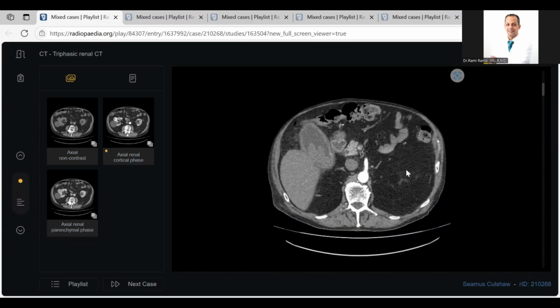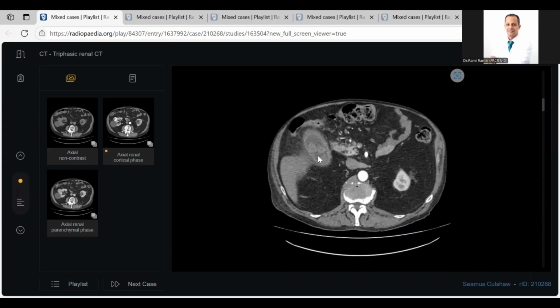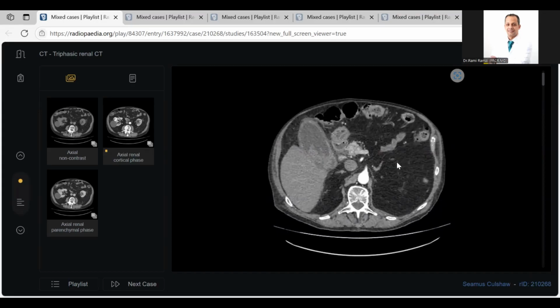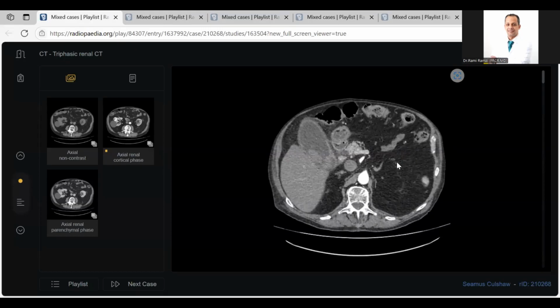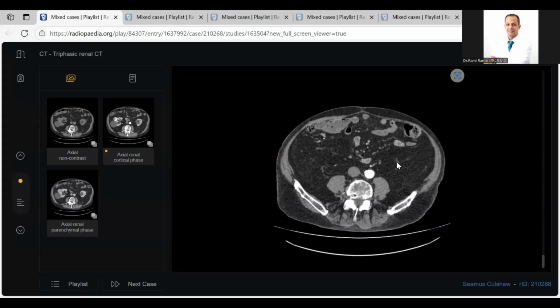Okay, my colleagues. By the way, this is a gallbladder. Almost this is stones. There are many types of stones inside the gallbladder. Many of them are calcified and many of them are not calcified. Cholesterol stones are not calcified. It may be cholesterol. Why not? Because it has a hypodense center. Maybe. Okay. Second point, it is overextended. It is surrounded by minimal smudging effect. It may be acute on top of chronic. Okay, no problem. If you tell the examiner like this, you will cover everything.